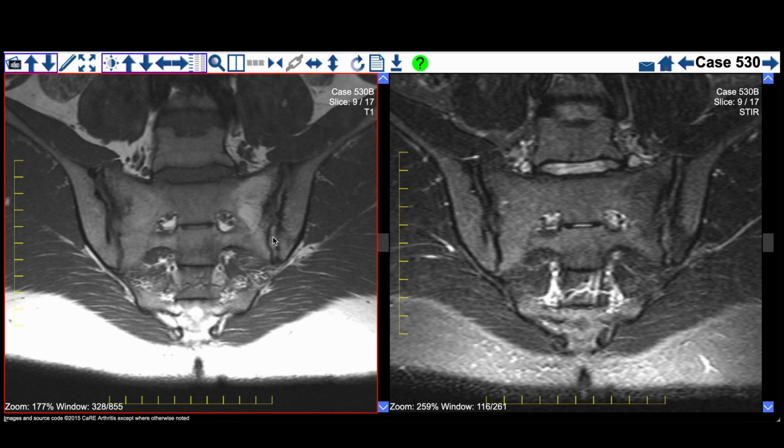So this is fat metaplasia in an erosion cavity, otherwise known as backfill, the infilling of an erosion cavity, a term borrowed from the construction industry when you're building a house and you have a hole to lay the foundation in the ground, and you refill the hole with dirt to pack the dirt around the foundation. This is an analogous situation in the erosion cavity.